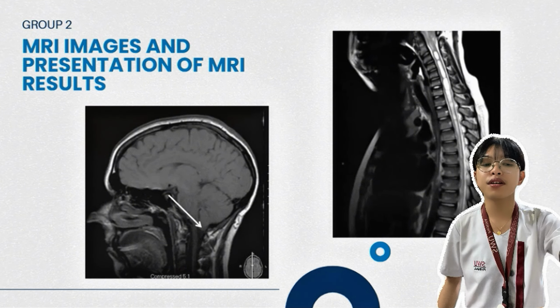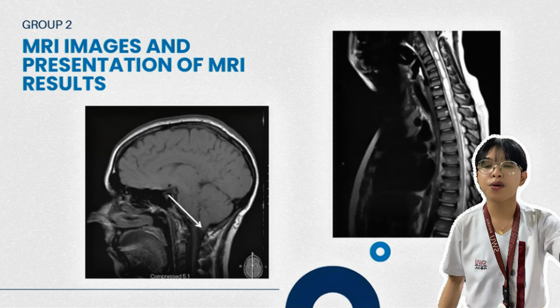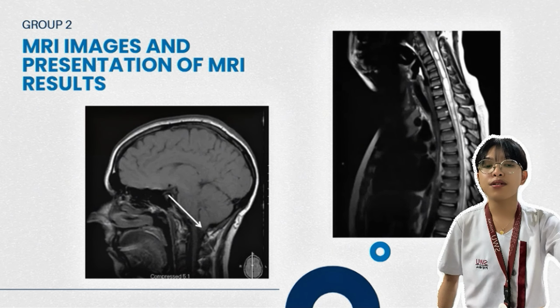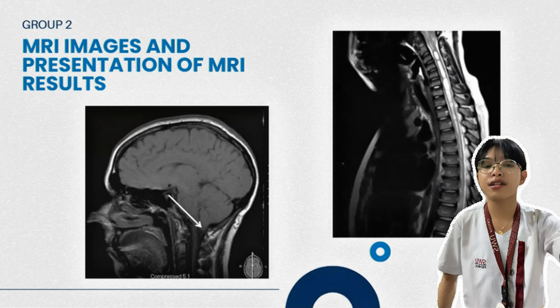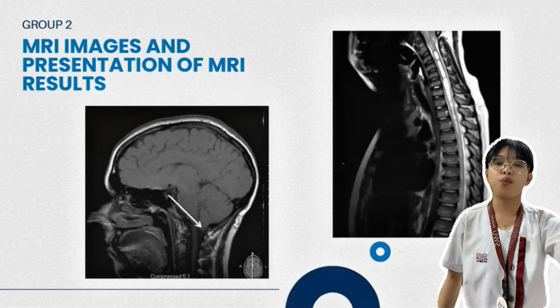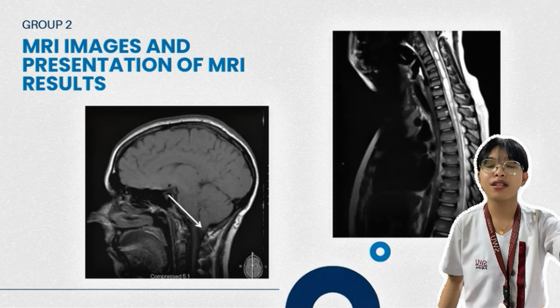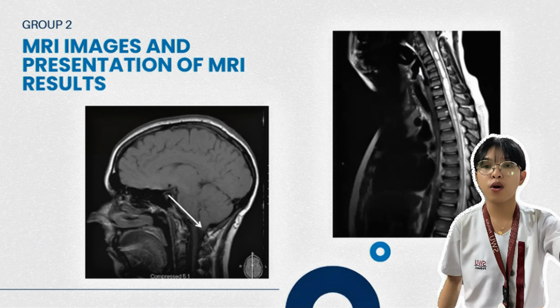Upon further imaging all the way down, you can see that hyperintensity in the cord really extends down to the mid thoracic spine. So, of course, what is her diagnosis? As a clue, because we were talking about Chiari, her diagnosis is a Chiari 1 malformation, or the type 1 Arnold Chiari malformation, associated with syringomyelia.